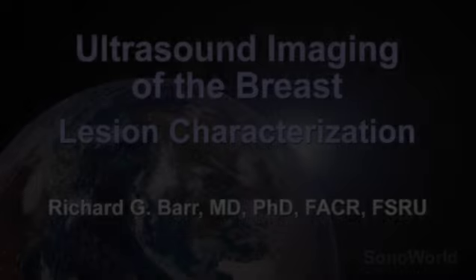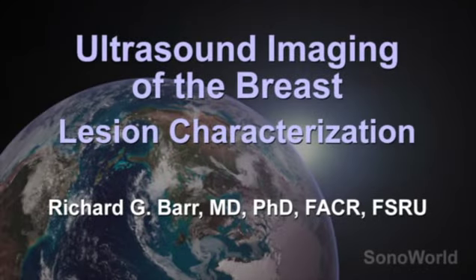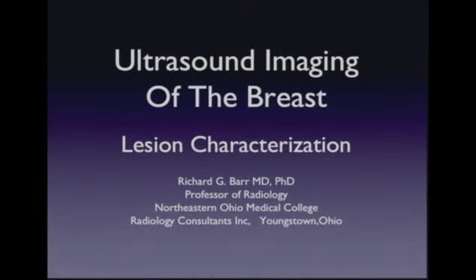Today I'd like to give you a talk on an overview of breast ultrasound highlighting the BI-RADS classification. I'd like to give you a general talk on ultrasound imaging of the breast, talking about lesion characterization. I'd like to go over some of the things that I do when I'm doing an examination, as well as review the BI-RADS categories and characterization of lesions.